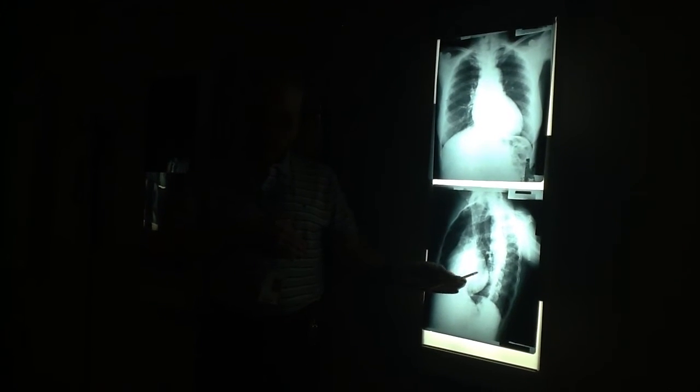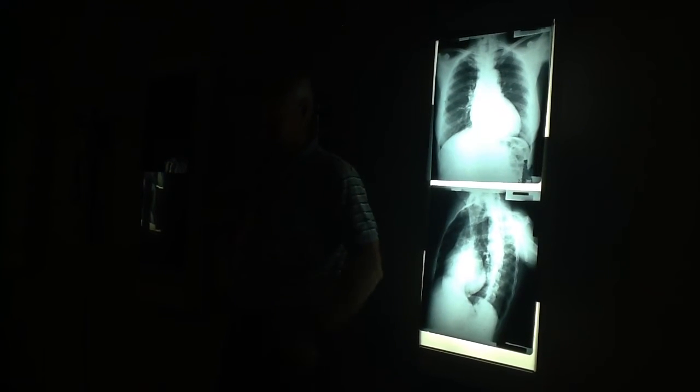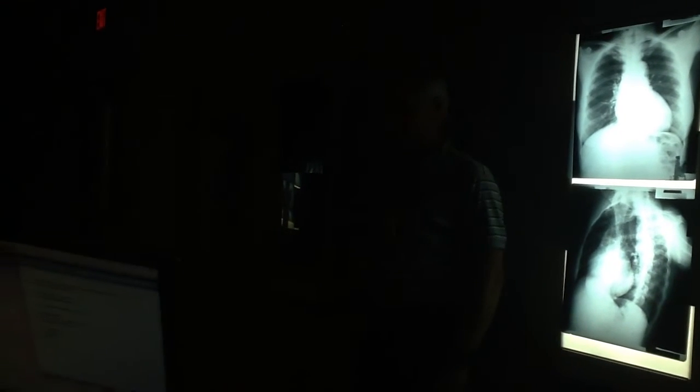So on this view, you're saying the heart went that way. No, the heart's over here. It didn't go over here. Other way. PA. The heart sits on an angle like this and like this, because it points forward on the lateral view and it points down to the left on the frontal view. Down here. So did we go this way? Yes, that's an LAO.